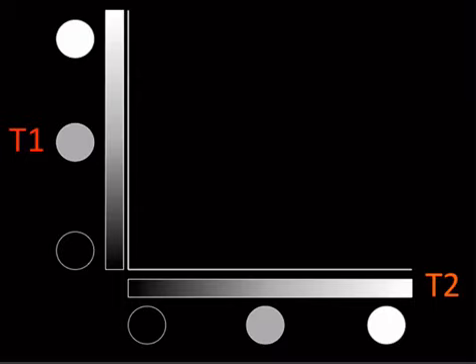The first one that you come to is T1. Another way to remember that, so you don't get your axes mixed up, is that a 1 sort of looks up and down, so this is up and down, and then the other one is the other one. And then black, ISO, and then bright, black, ISO, and then bright in that direction. So here we go. This is where we start out, and so for T2 we're on the bright part, and for T1 we're on the ISO part. See that? Here and here.